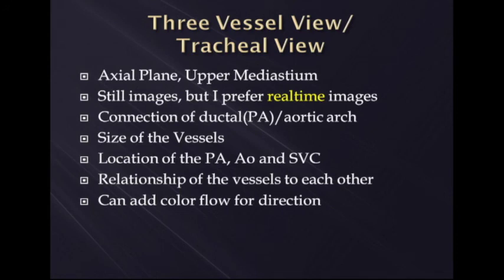So I hope you enjoy this update, or latest update, of how to look at the fetal heart, starting first with the four-chamber view of the heart, proceeding to the outflow tracts, and then to some of these newer views.